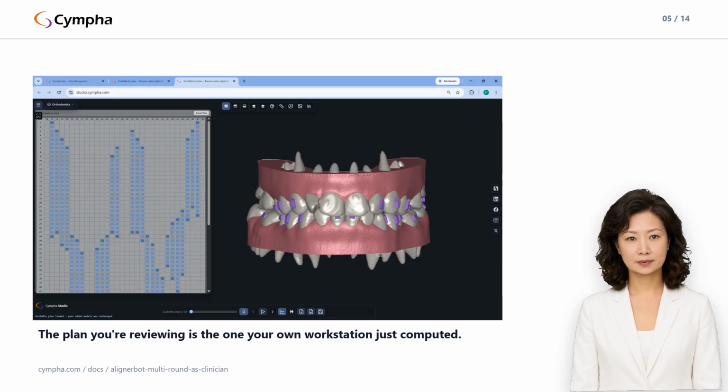The case auto-advances, the status briefly hits approved, then flips straight back to designing as the next cycle begins. No routing click needed this time. The same seat still holds it. On its next poll, the agent claims the case again, and OrthoPlus runs the Phase 2 cascade, generating per-stage aligner shells or arch models or bracket guides, depending on the design kind you set at intake.